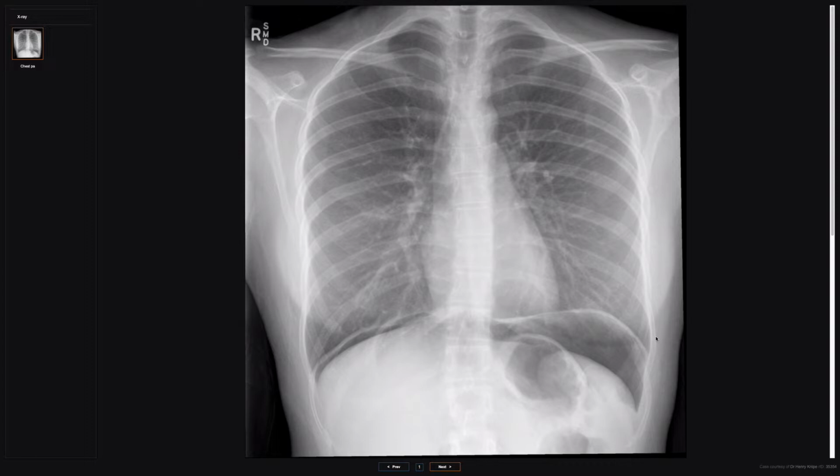a chest x-ray. And the reason for that is because traditionally, when people attended emergency departments and there was a query about pneumoperitoneum, they would get two radiographs acquired together, an erect chest x-ray and an abdominal x-ray. And I'm talking about more than 10 years ago. And the idea is that an erect chest x-ray allows the air within the abdominal cavity to rise and float underneath the diaphragm.